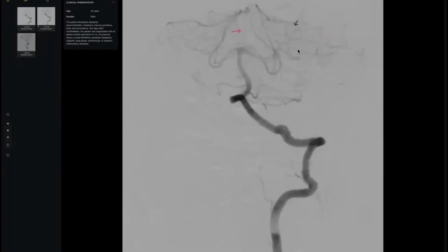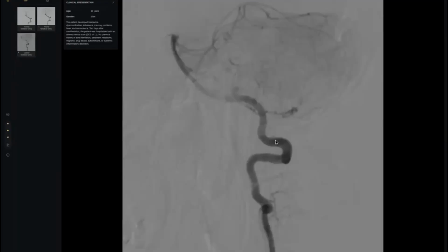When we did the angio, see, my colleagues, this is not a normal vertebral artery angio. Why? Because there is a paucity of main arteries, and the main arteries like the superior and inferior cerebellar arteries are reduced. In an image like this, don't concentrate on telling the examiner, oh doctor, the AICA is not seen, the PICA is well seen.